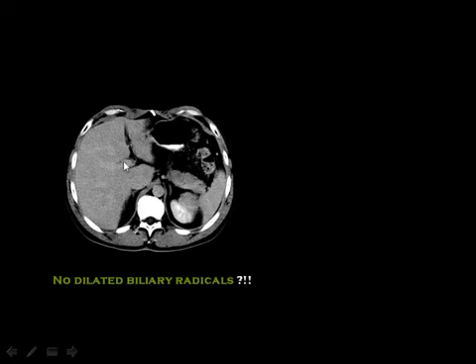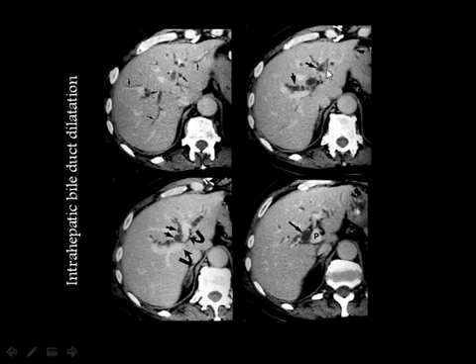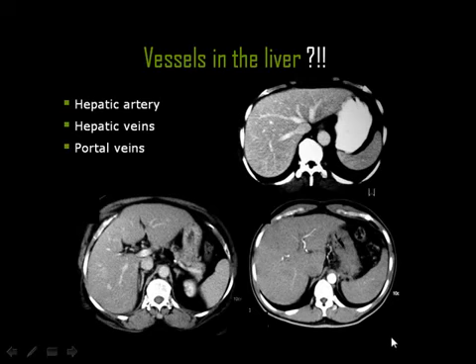Then if you look at the liver, you should not see any bile ducts, because the normal bile ducts are not usually seen by CT. But if you look at the CT and you can see multiple hypodense linear shadows, these are dilated biliary radicals. And this is an example of dilated biliary radicals in the liver. You can see multiple linear hypodense shadows throughout the liver parenchyma. Then you know that the patient has biliary obstruction, and you should search for the cause of obstruction, whether it's calculus or neoplastic lesion.